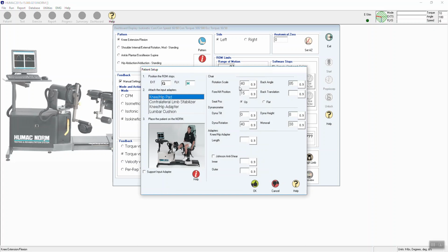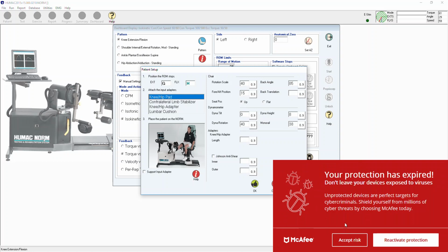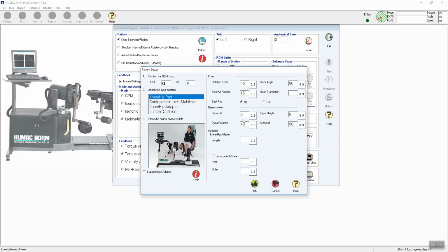And then we move over here. The chair settings. These are recommended settings. So the most important one is the black 40 for the dynamometer pedestal, which is down here. For the dynamometer, tilt is 0. Dynamometer height and black 40, that's the most important settings for the dynamometer, which is down here.